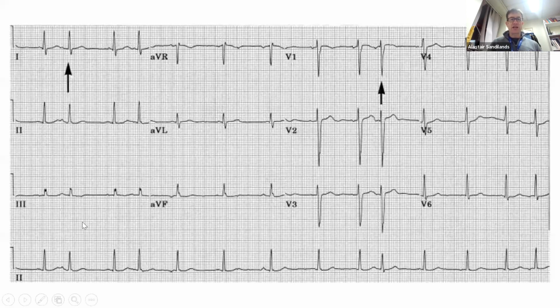This is just another example of this for you to have a look. There's arrows here. So you see again that there's a P QRST. The QRST is exactly the same, but then you can see this P wave here that's being generated close to the T wave before it conducts again to the ventricles. Pause, P QRST again, and different P, and then another QRS, which carries on.